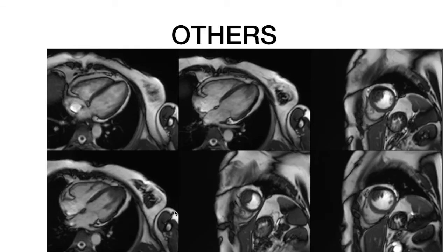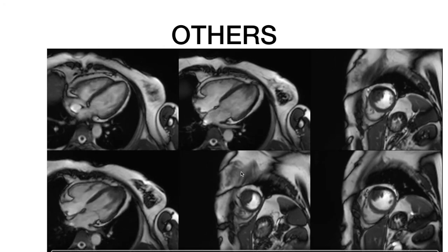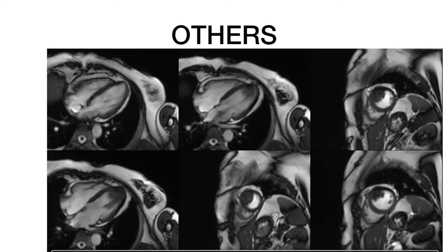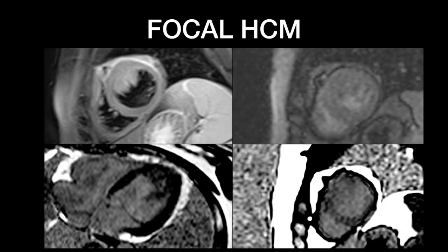Other conditions where CMR is indicated to differentiate myocardial lesion is focal hypertrophic cardiomyopathy, where it shows normal myocardial contractility with thinning and thickening in the diastole and systole, plus imaging characters absolutely similar to that of myocardium in all sequences, suggesting it as a focally hypertrophic myocardium and not a neoplastic lesion. So now we know the conditions and the structures which can mimic a cardiac lesion but are actually a part of normal variation or non-neoplastic pathology.